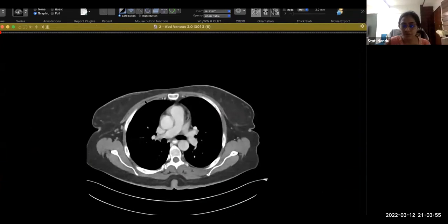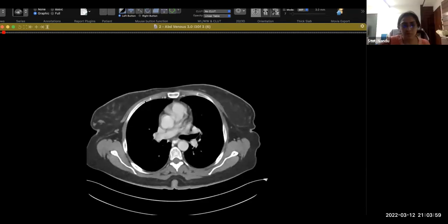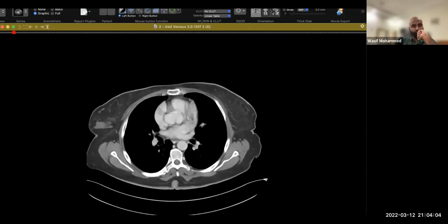So I'm provided with post-contrast axial CT images, just scrolling from craniocaudally.